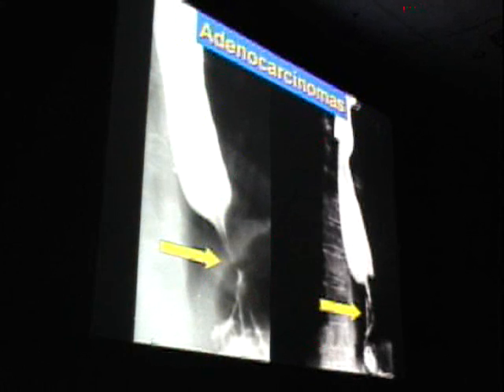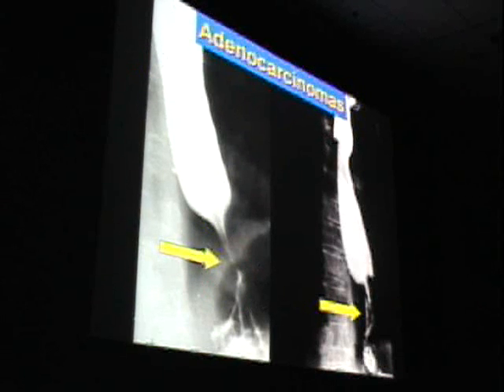Now here's the lesion on your left, which can be problematic. This is a so-called pseudoachalasia, where we have diffuse infiltration of the wall of the esophagus, and it can look very similar to achalasia. Key thing here is to get this patient scoped. With achalasia, the scope is going to drop right through into the stomach. With cancer, obviously, you're going to run into a dead end of stricture, okay? And metastatic disease is also in this differential. And on your right, you see somebody with a big distal cancer at the GE junction.